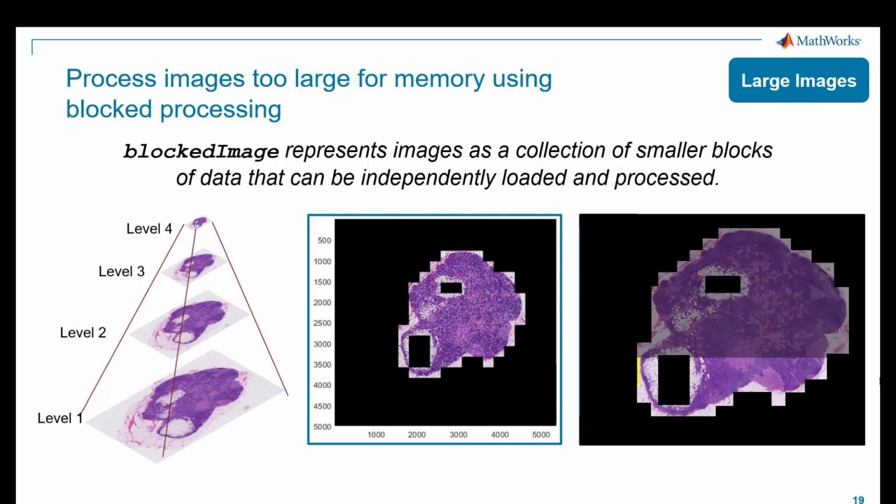So we're going to spend a few minutes talking about how to use blocked image functionality. But there's a second aspect to this discussion. That is, what exactly do we want to calculate in each block? This could be almost anything. You may, for instance, want to detect tumors in a pathology image, or to count labeled markers in a fluorescence imaging workflow. For our purposes, we're going to try to detect, segment, and count nuclei in the non-masked portion of a whole slide image.